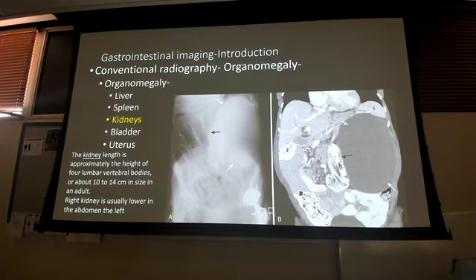Kidneys, rare to see on x-ray. But, oh boy. Now how do I know that's a kidney and not a spleen? I don't. I got the CT, and here's the kidney, and here's the giant cyst that is sitting on that kidney. So the kidney is not actually enlarged. It just has a giant renal cyst on the outside of it.